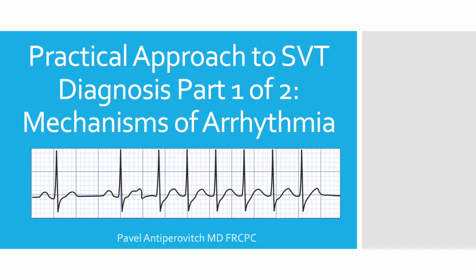Today we'll be discussing a foolproof approach to SVT diagnosis on single lead tracings. This is a two-part video. In part one, we'll be building an approach to formulating a differential diagnosis and discussing the mechanisms of arrhythmia. And in part two, we'll apply the learned concepts to a series of tracings.